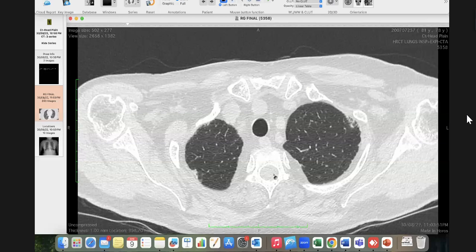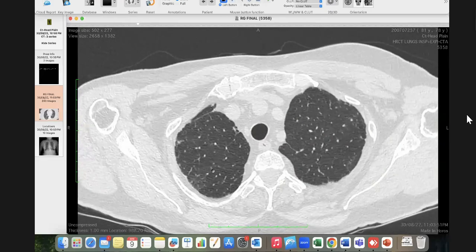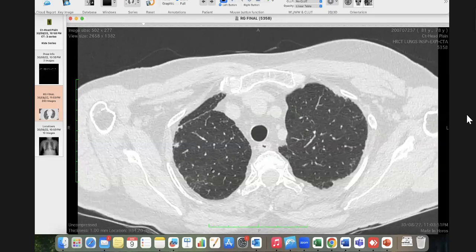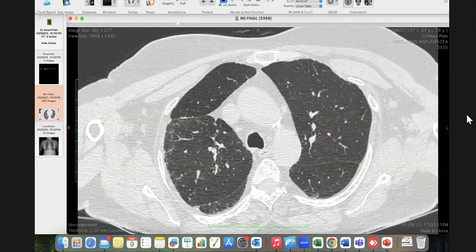First is something like this, which is like early ILD, and second is where the findings are a total mishmash. You feel that I have seen reticular opacities, but I am not sure about traction bronchiectasis. Those are truly unclassifiable images, and those cases you should put in indeterminate for UIP and definitely advise a follow up after 3 to 6 months.